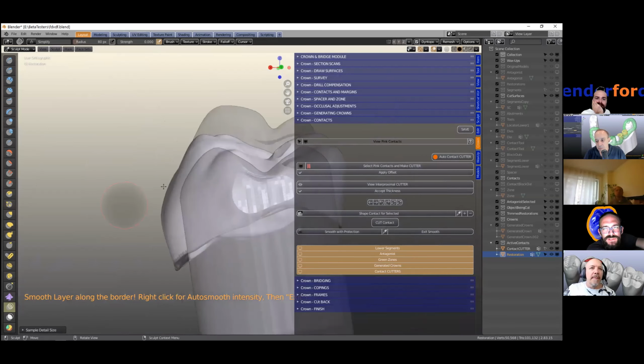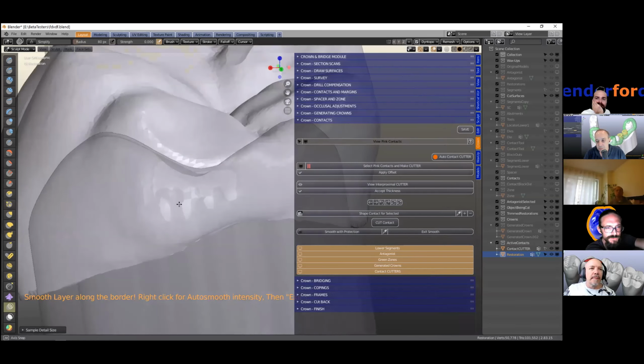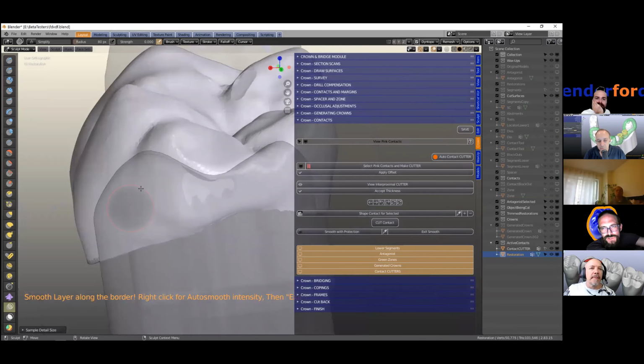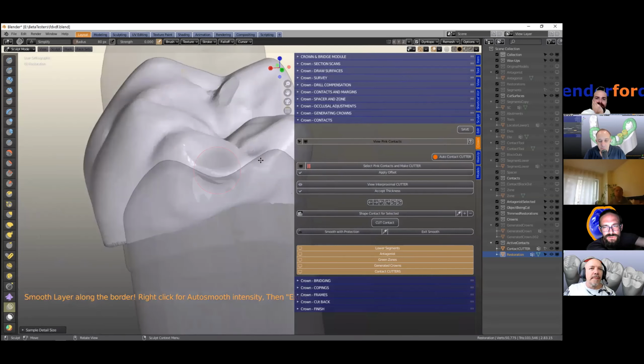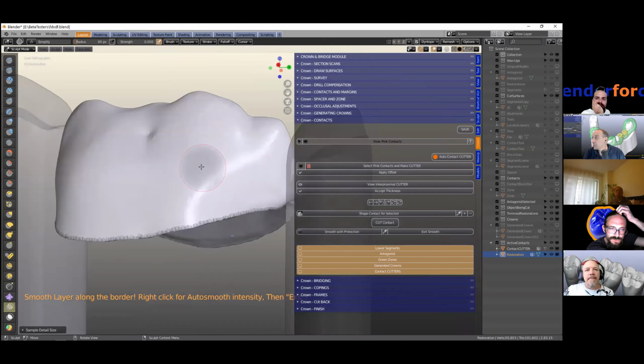Michael, perhaps it's not possible, but just a question. Could you do some mask protection with the vertex group? As we have shaped the contact area, we can also just draw the contact area and see it in a colorway. But afterwards, we've got a concave shape of the proximal face. So if we make the protection but inverse it, what we have drawn as a contact area we keep on the contacts, but the rest we have to make convex.